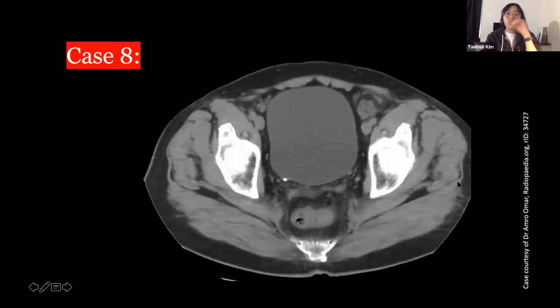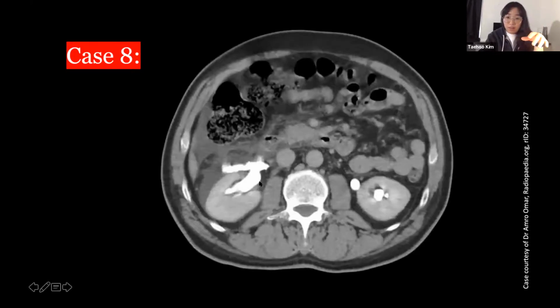And then when we do inject contrast and wait for 10 minutes for the contrast to be excreted by the kidneys, then you will have this. You see how beautiful the left kidney is. You see the contrast material in the collecting system in the proximal ureter. On the right side, see, it's all leaking to the perirenal spaces. So this is called urinoma, collection of urine with active contrast extravasation. So that's when you call urology. Any questions so far?